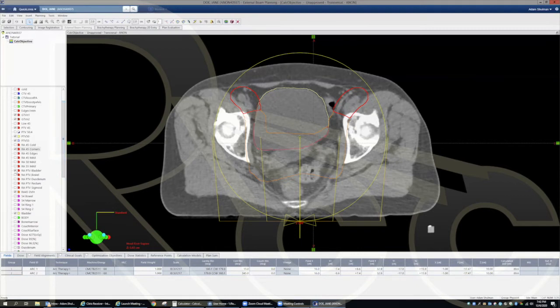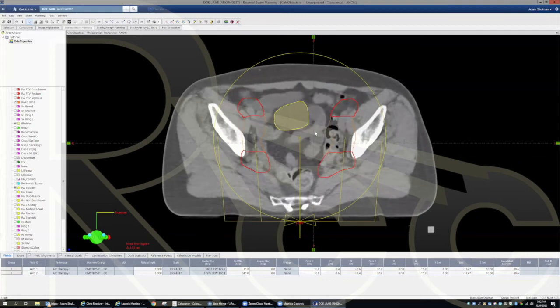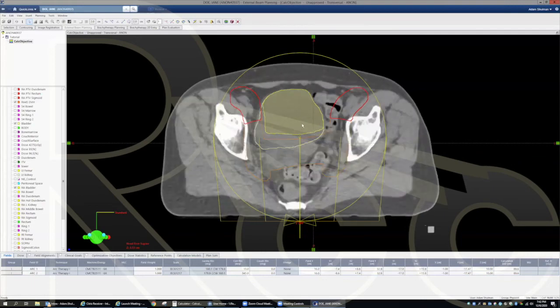So for example, right here. Either option is fine, honestly. They both sort of work with this method. You can either optimize on this crop structure, or you can optimize on the whole structure. When you see me go through the optimization process, it shouldn't really affect either way that you do it. In this case, I'm going to optimize on this crop structure. They were already created, and I'll just use it that way. But the same process you'll use either way.